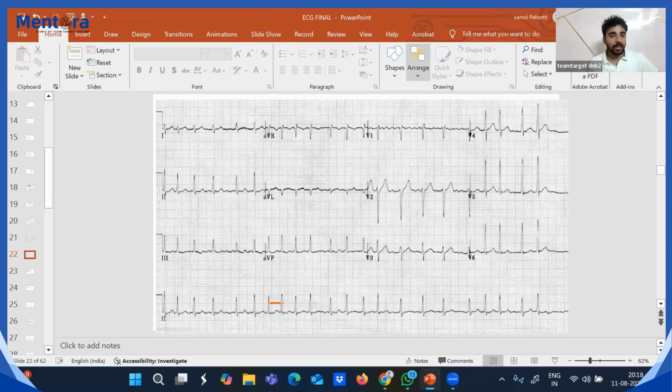In atrial fibrillation also sometimes some P waves can be captured. Okay, sir. So for our level, you just see the irregular complex, it's narrow complex, irregular, P waves mostly absent, it's AF. So that's why I intentionally kept this ECG, because normally exam ECGs won't have any P waves, but patients don't give you that time. Patients present like this only, 1 or 2 P waves you may see, but don't confuse and think P waves are there so it's not AF. It is AF, right? Don't jump to multifocal atrial tachycardia unless you have COPD or bronchial asthma or 3 different morphologies of P waves, then only you can label it as multifocal atrial tachycardia, right?